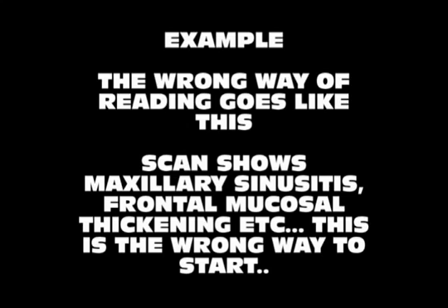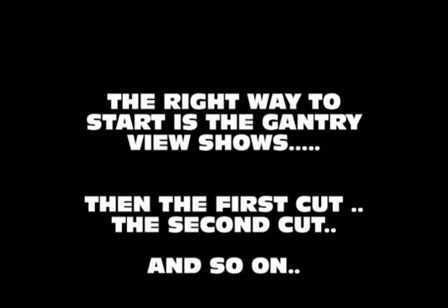So what's the right way to start? Read from the first cut and read only the anatomy. Sometimes you may wander away, never do that. The right way is to start from the gantry view, which shows the first cut, the second cut, and so on. Now, what does the gantry view show? Is it useful? Yes, it does. Now let's start reading the scan.